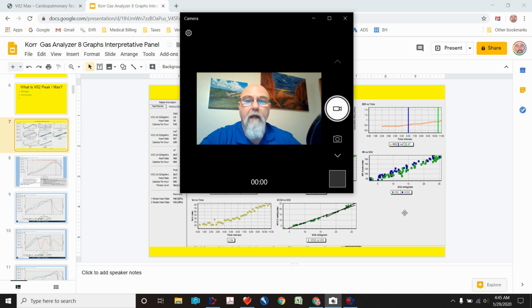Okay, welcome back. So this video is going to be about evaluating the quality of the test, and we're going to look at certain parameters. So let's get started.